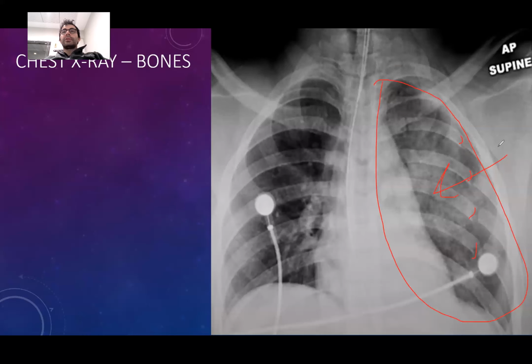There are multiple costal fractures, and there is some area of air outside of the hemithorax. So it was a major trauma that caused a big area of contusion in this lung. But this could very well be pneumonia if there were no costal fractures. Okay.